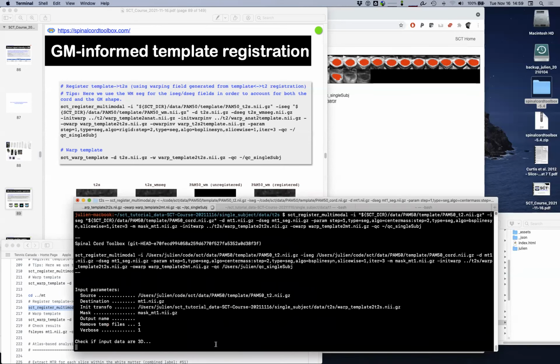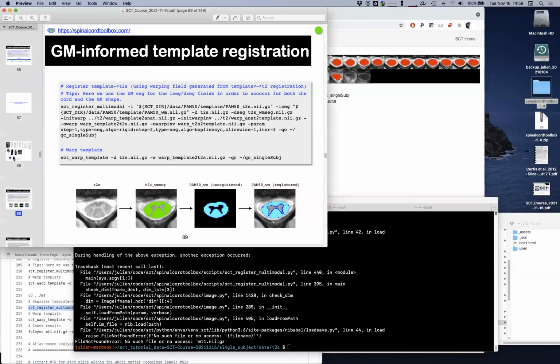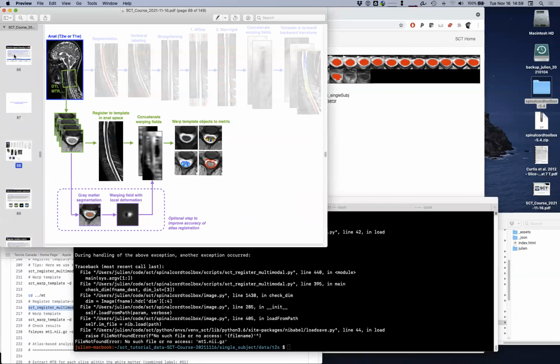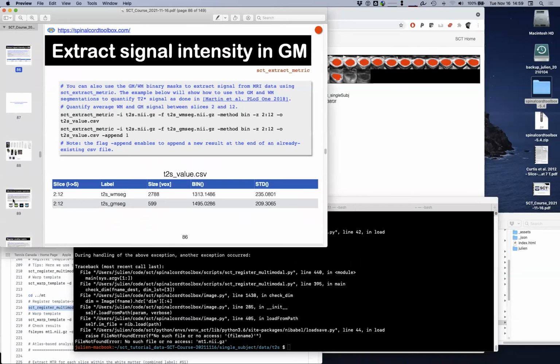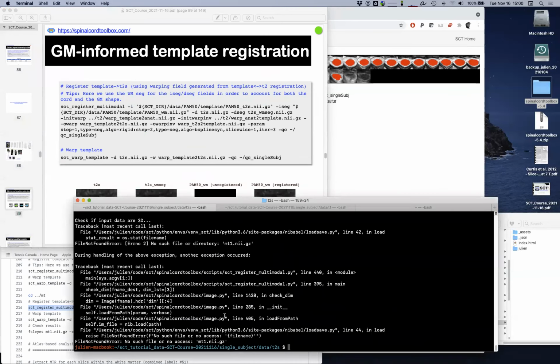Oops. Oh yeah, I need to go into the proper folder.